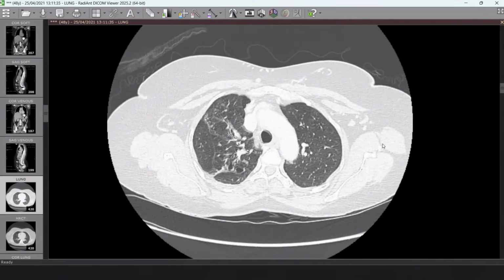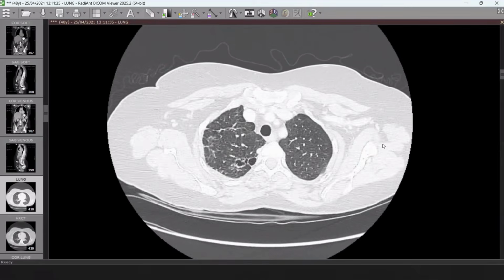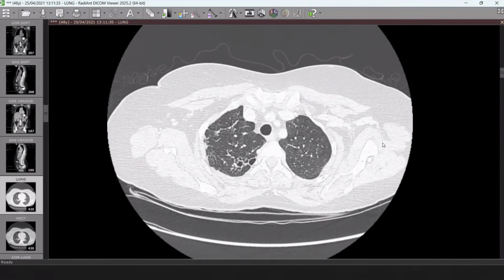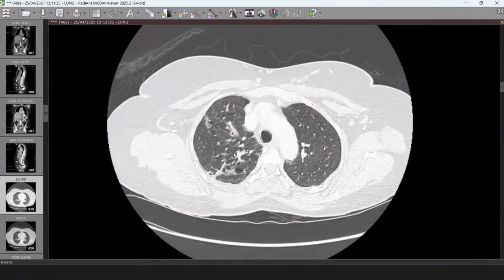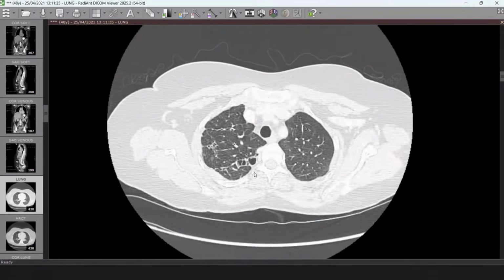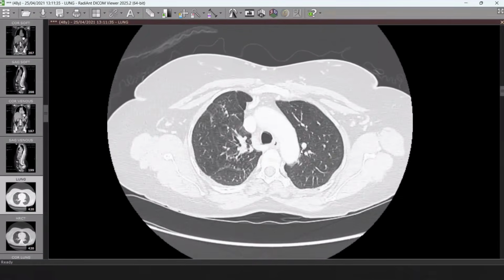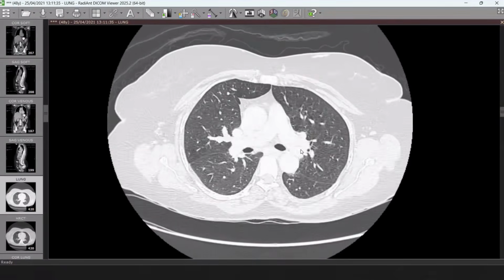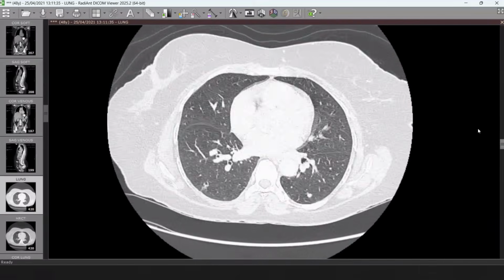This could represent sequelae of a prior infective etiology, such as granulomatous lung disease, like tuberculosis. Right, okay, that's fine. In the last session, I think we enumerated together the causes of apical lung zone fibrosis. In this case, it's focal coarse fibrotic reticulations with some cicatricial bronchiectatic changes. This most likely, as you said, is sequela of an old granulomatous infection, most likely TB. And indeed, this patient had a history of TB in previous scans.